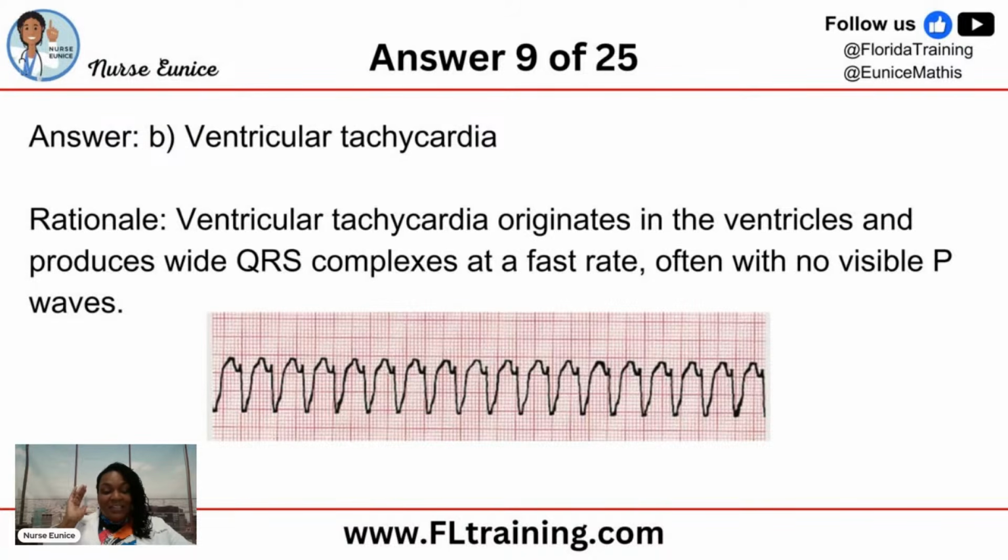So I'm on the cardiology unit, young nurse. I see this on my patient's monitor. My patient's talking to me, you all. So I run out and I call the doctor and I'm like, hey, doctor, such and such. The patient had a 20 beat run of VTAC. And you know what the doctor said to me? What else? So just because you see this on the monitor, it doesn't mean your patient is critical. It means that you do need to notify the doctor.